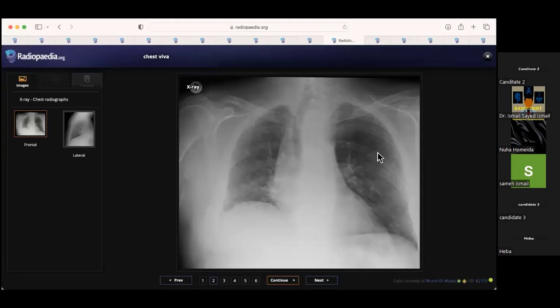You're right. But this lung looks okay-ish, a bit normal. I'm wondering if there is any history of operation. Yes, there is a history of operation. In my routine practice, I will correlate with the previous images and with the clinical history, and usual interstitial pneumonia will be on top of my differential. How can you explain that the left lung is normal? With the history of operation. Of what kind of operation? A lung transplantation. Lung transplant, yes.